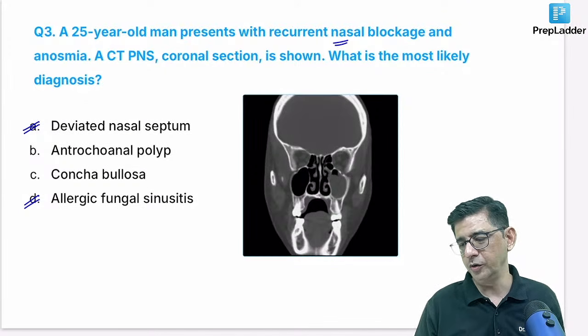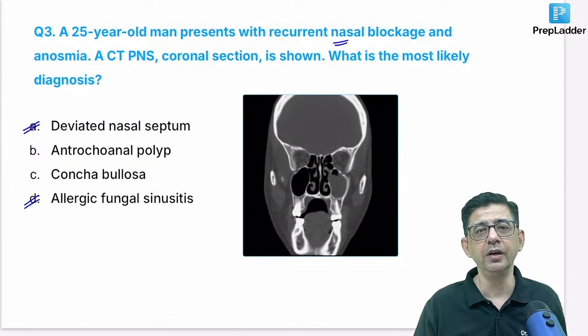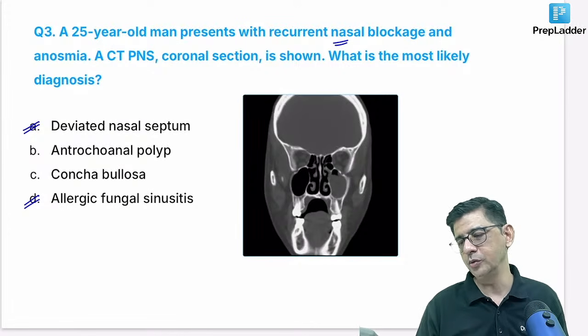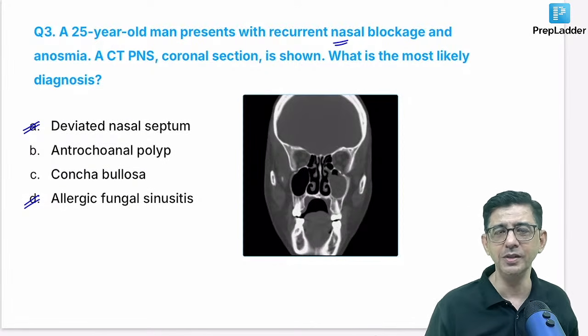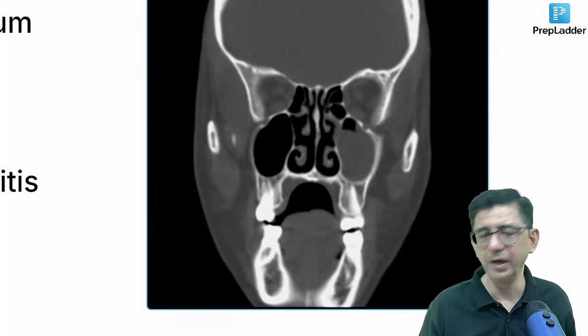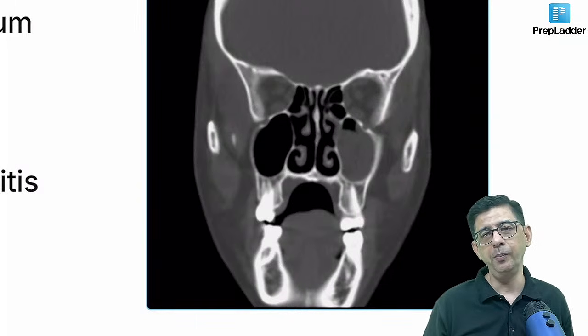The physical appearance of the two is grossly different. The image is a very straightforward one that you would have read multiple times. Yes, Ravi Kumar, Sayyid Usman, hit the comment button, guys. Should I zoom in? It's very easy to pick up. That would be an antrochoanal polyp.